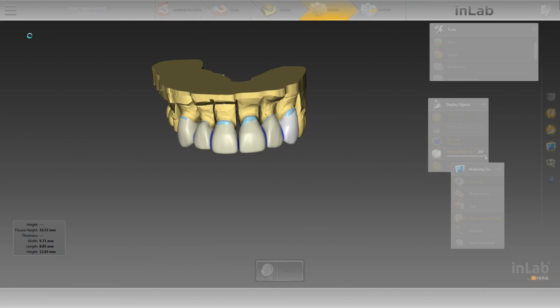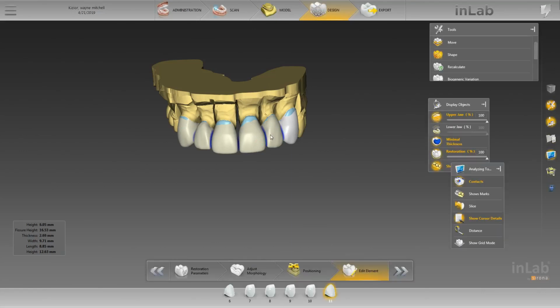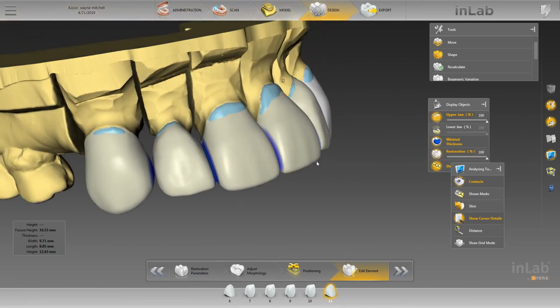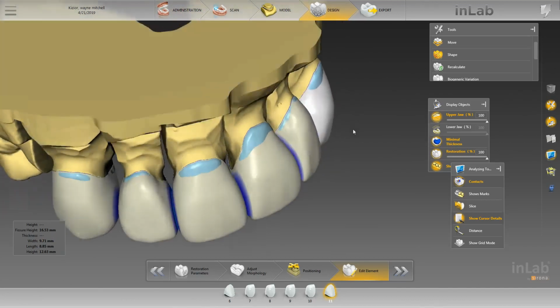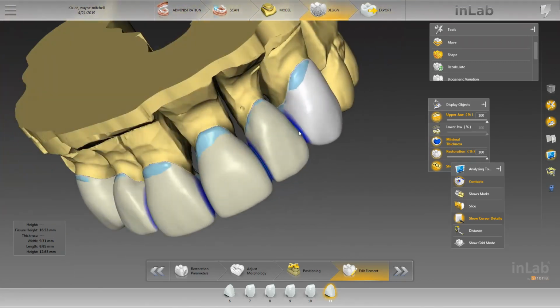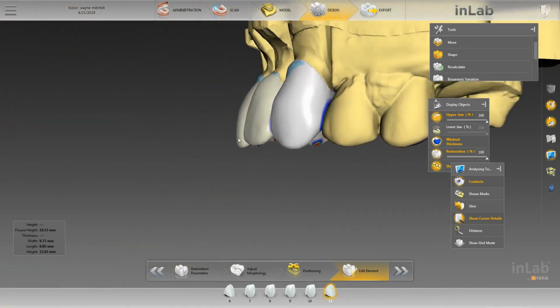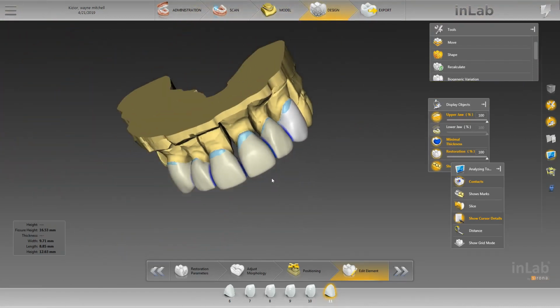God, I love what I do. Those laterals look nice, real nice. We can maybe bring things out right here, this mesial contour line, and if we do bring it out, it'll kind of make this more in line, but this kind of does give it a natural appearance, if you guys can see what I'm talking about, where the light's reflecting on that contour line. If we turn it from this way, you could see it can come out right here, but then again, in nature, nothing's perfect, and that's kind of what makes it perfect. I like it. Let's just leave that the way it is.